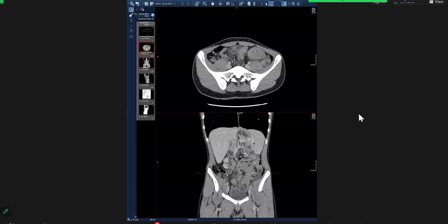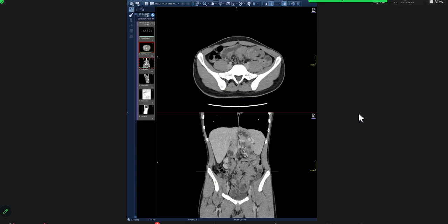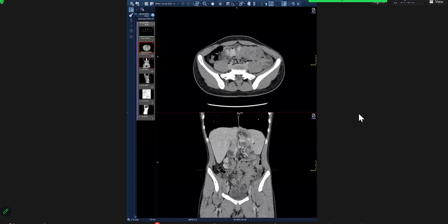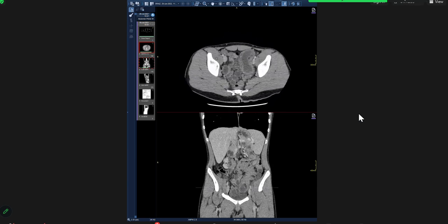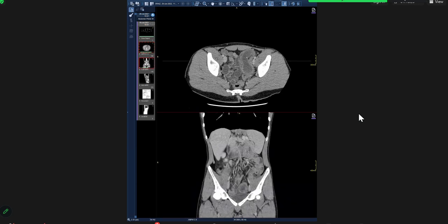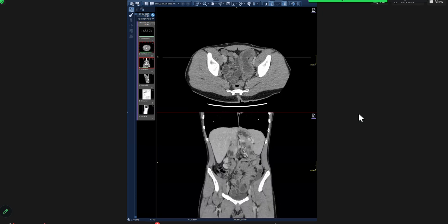There are no signs of bowel ischemia. So I'll pick up the phone and immediately convey my findings to the referring clinician, as it's likely intussusception, likely due to a well-defined lesion. It could be due to a gallstone. Are you talking about this, on the coronal, this rounded lesion? Yes, this one. Okay, yeah, it's elongated, so it's intussusception.